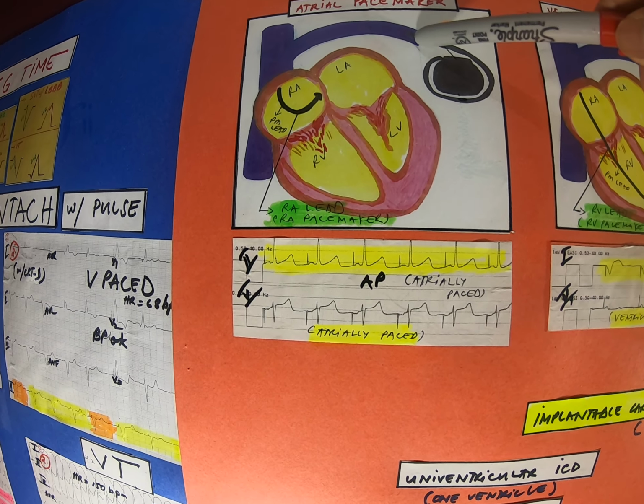Good bite, good grip for good securement, and good contact with the generator and the tissues. Then the right ventricular lead will pass the right atrium going to the right ventricle, the tip of which is located at the right ventricular apex. Again a good grip and bite for good securement, and good contact between the pacemaker generator that gives the impulses and the tissues of the right ventricle. So we have two leads in here, one right atrial lead, that is your right atrial pacemaker, and one right ventricular lead, that is your right ventricular pacemaker.